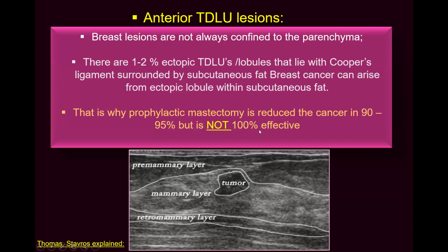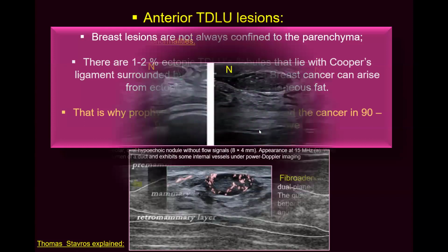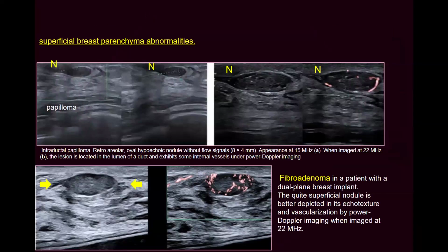Okay, we mentioned this. Okay, this is papilloma, and this is fibroadenoma. Can you tell me, what do you suggest?